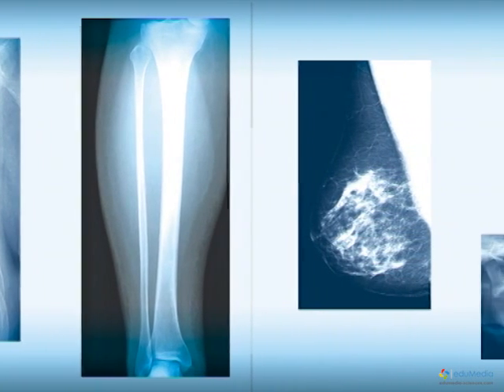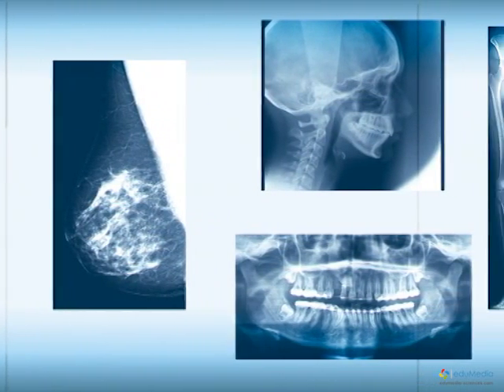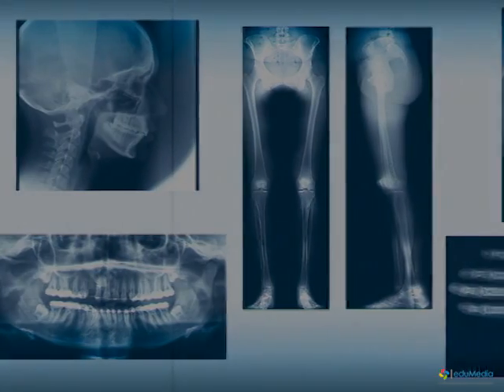Radiography rests on the principle of differential absorption of X-rays by tissues. The results obtained are photographs in shades of gray that the physician will be able to interpret.